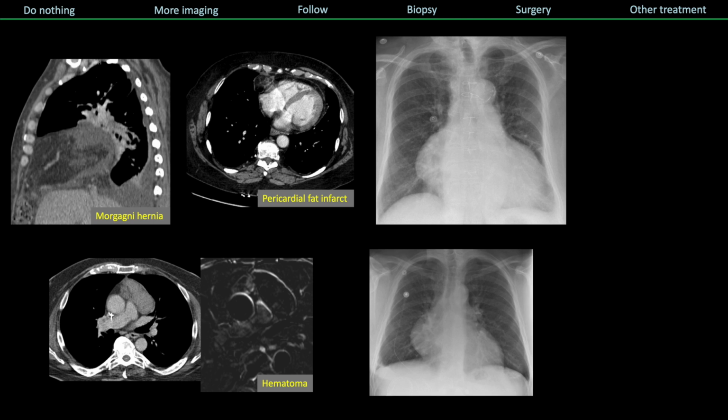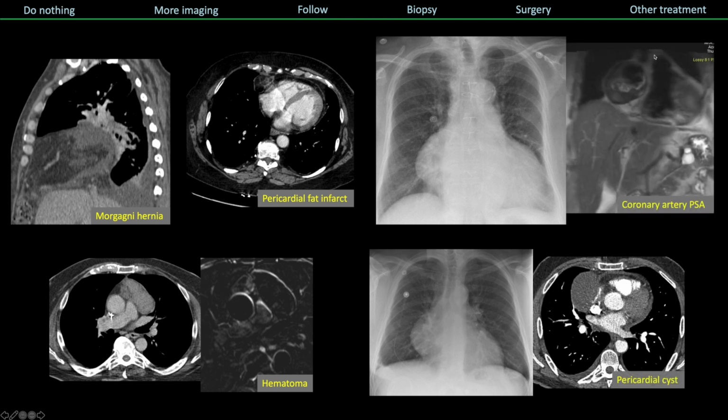And then there are lesions where you need to know the clinical history and have an idea of what's on the menu. These two patients look identical on radiograph. Big mass in the anterior mediastinum, hilar overlay sign. One has median sternotomy wires, the other doesn't. Top patient, non-contrast MR, T2 hypointense rim consistent with hemosiderin as well as a flow void. This is a huge coronary artery pseudoaneurysm. Treatment in this case is going to be endovascular or surgical. Bottom one, a non-enhancing pericardial cyst.